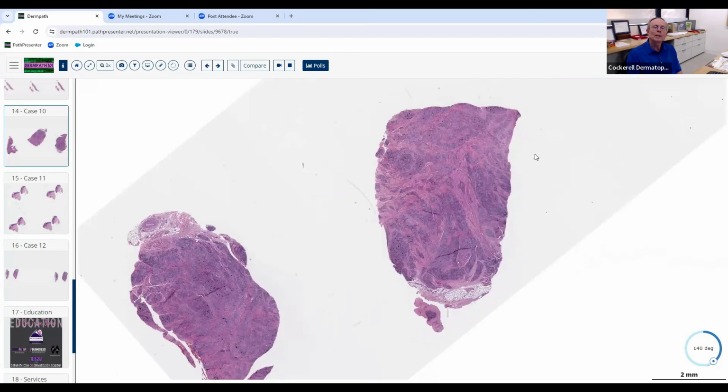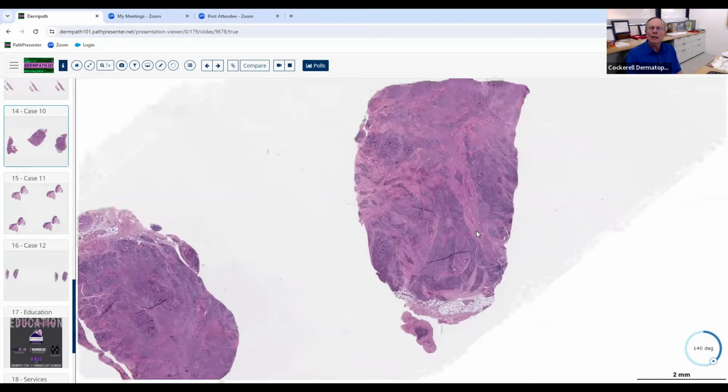Now, if you saw this patient and you thought this condition was a basal cell or something, that's one thing. But if you really think it's an inflammatory process, I'd much rather get a deep punch biopsy so we can really assess this pattern. And at low magnification, you can see that basically it's got this nodular infiltrate. A lot of these cells are somewhat pale. Now, there are some lymphocytes, I'm going to bet, admixed within this, but a lot of them look like little nodular aggregations, and most of them, I'm going to bet, are going to be histiocytes.